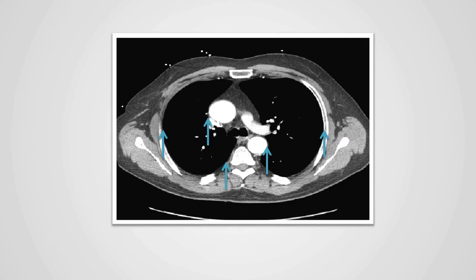This is a CT examination of the thorax. The reason I'm showing the CT examination is to outline that we can predict where interfaces or borders will be formed on a chest X-ray by knowledge of the anatomical structures. If we're taking a chest X-ray examination and the X-ray beam courses through the body from posterior to anterior, we can predict that there will be an interface formed by the lung and the chest wall.